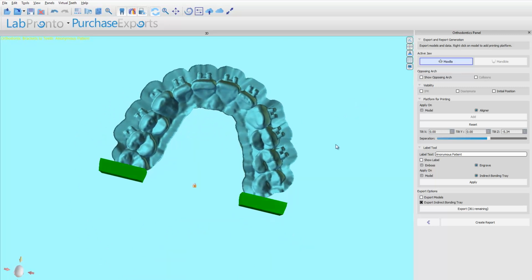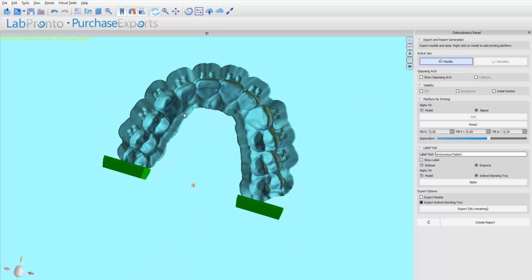And that's it. Hopefully this video has helped to explain the workflow.